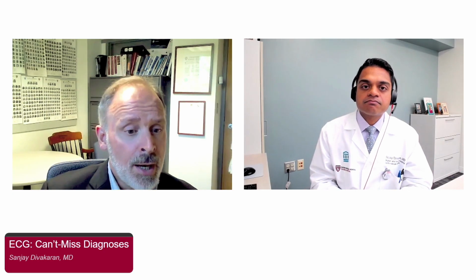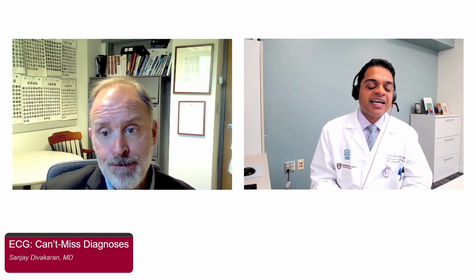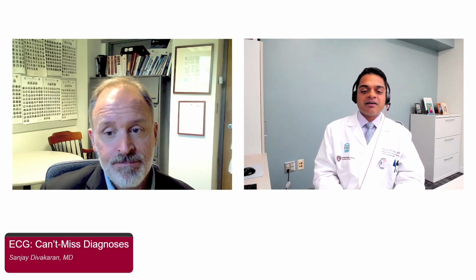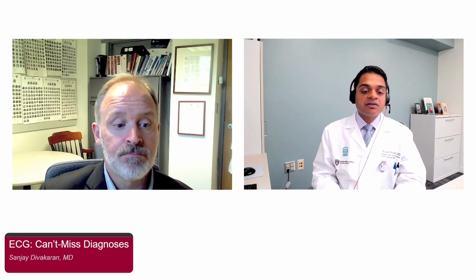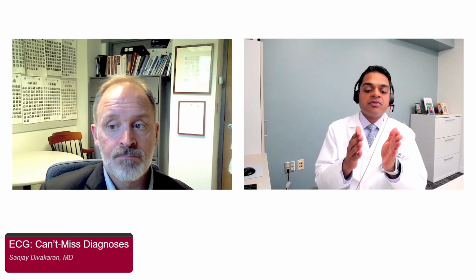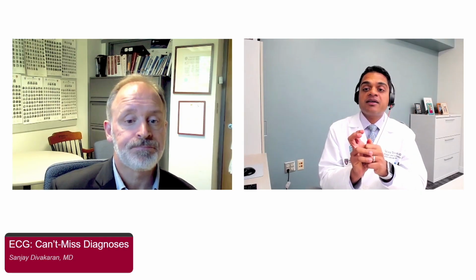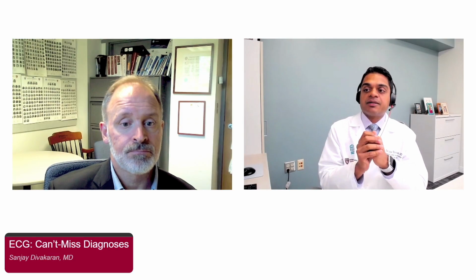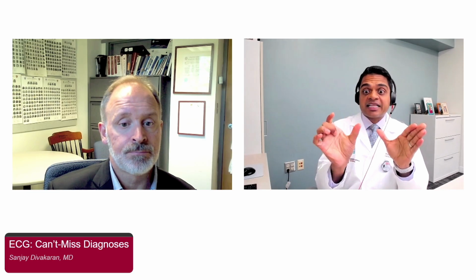Excellent. Okay. So please comment on measuring the QT interval in patients with bundle branch block. Yeah, great. So this often comes up, and I'm glad this question was raised. If you look at the literature, there's not clear direction on this, but in my study of this, what I use clinically is that I take the QRS duration above 120, and I subtract that from the QT.